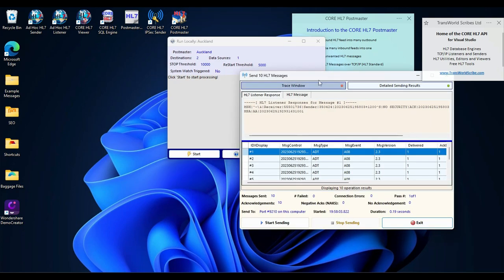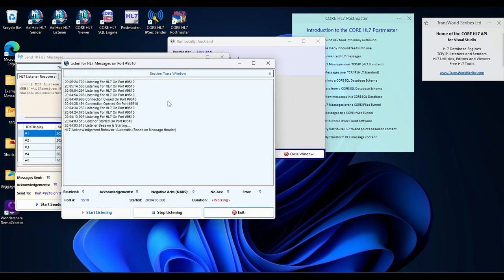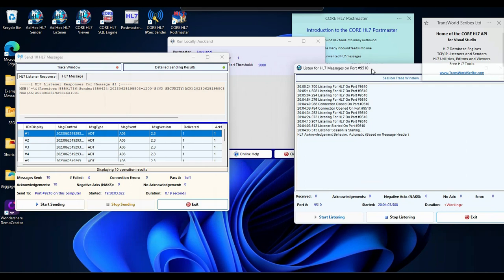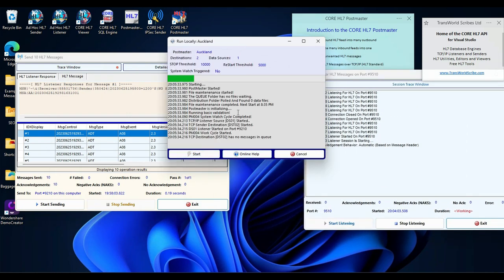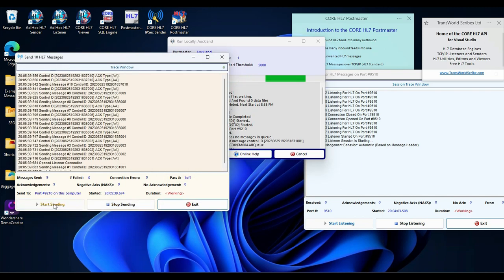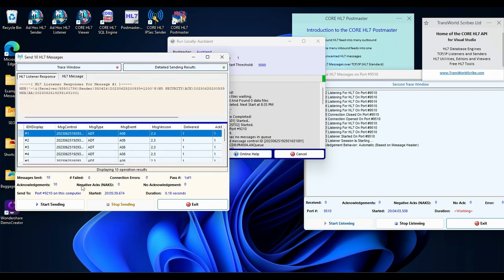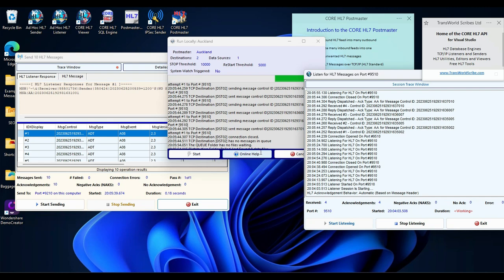We're going to start with our sender here. We're going to have our listener over here. That's the endpoint that's going to get the patients whose last names begin with L to Z. And we start sending the messages out. Here they are coming in the front door. And there they are being sent. So we got 4 messages in there, which means we should find 6 messages in the folder destination. And that's it.